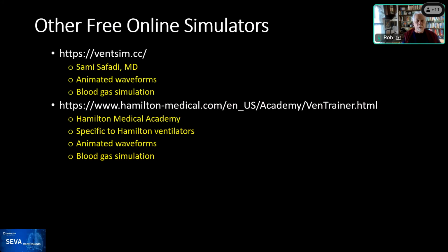Now, there are other free online simulators, and one that stands out for us is VentSim by Dr. Safadi. It also has simulated dynamic waveforms like you see on the ventilator, but it throws in blood gas simulation as well. So as you make changes in the ventilator settings or in the patient's disease conditions, you will see a simulation of what happens to oxygenation and ventilation. I don't know how accurate that is, and it probably doesn't matter. It just indicates a direction. For example, if you decrease the rate, then the CO2 is going to go up and the pH is going to go down.